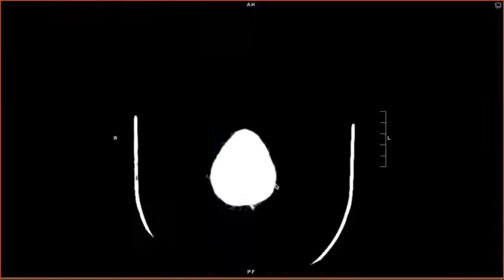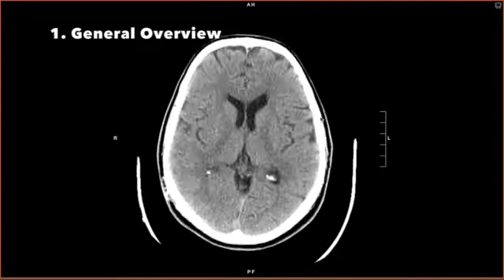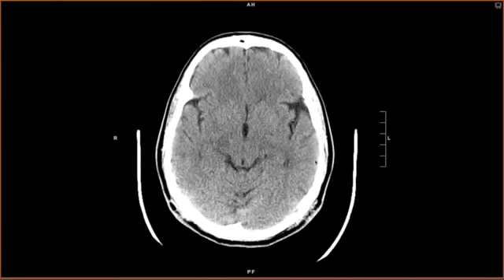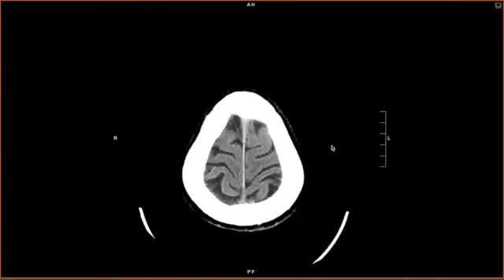Okay, so I stress that this is a conceptual approach. It's very simplified. And if you're going into radiology, your approach is going to be more detailed, and we'll talk about that approach in a few minutes at the end of the talk. So, the conceptual approach. Take a couple scrolls through the brain. Look for anything big. As you look at more, you're going to notice more. Okay, there's nothing big here.